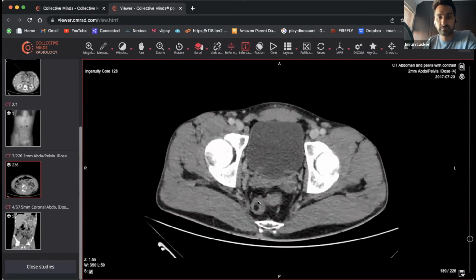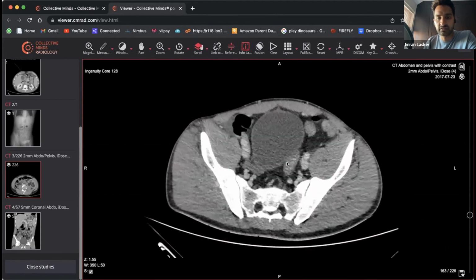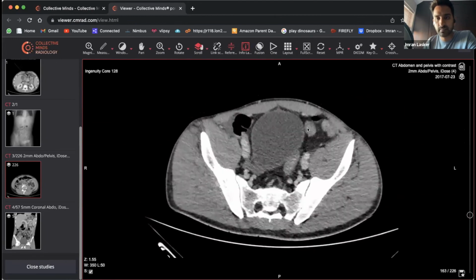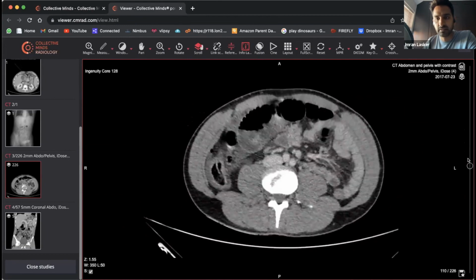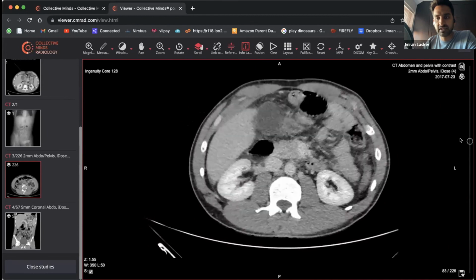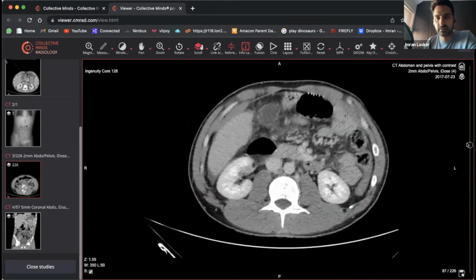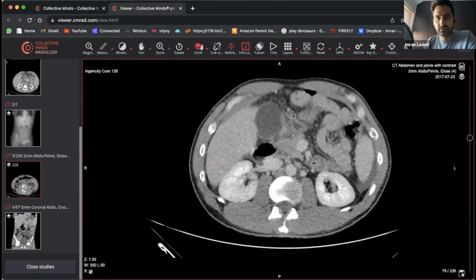So go from the bottom, quite literally, go along like so, and then we can see the bowel going this way. Follow my mouse. We're going this way, scrolling around. And then we can see that we're coming up to the descending colon, and you're coming up to the splenic flexure. As you come to the splenic flexure, you can see there's a little bit of fluid sitting there, coming across to the transverse colon, which is here. We're going right across the front.